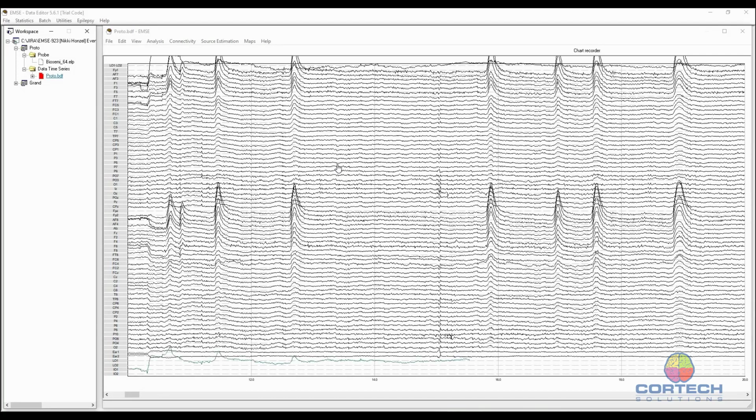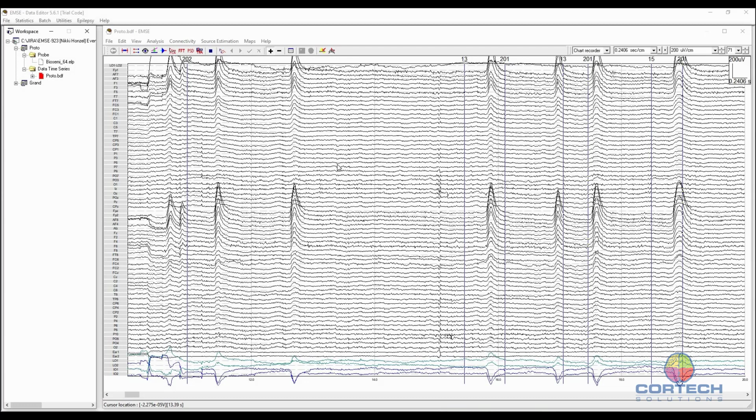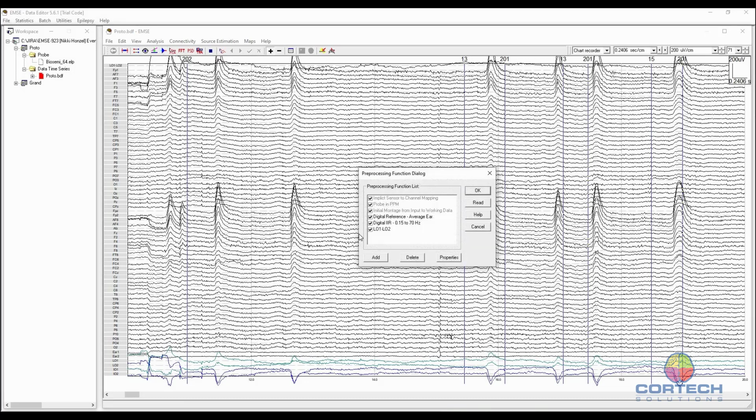Nikki, I think this is yours because you had more prominent blinks in your data than Lloyd had. So obviously it's not blink corrected, but let's see. It does have filters in the pipeline. And I mirrored the settings that you and Lloyd used previously.